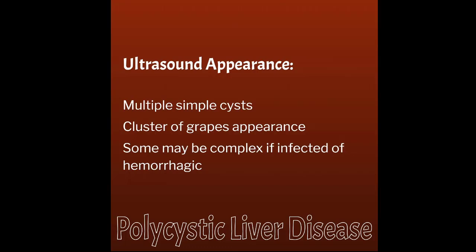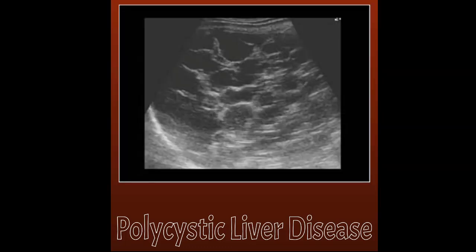Measure those. And then after that, if it's really just all simple cysts, typically what's done is maybe the biggest 3 are measured. Maybe you'll do the top 2 in each lobe. Kind of depends on what your radiologist wants. By no means do you need to measure every single cyst within the body.